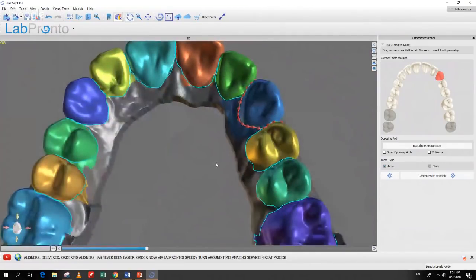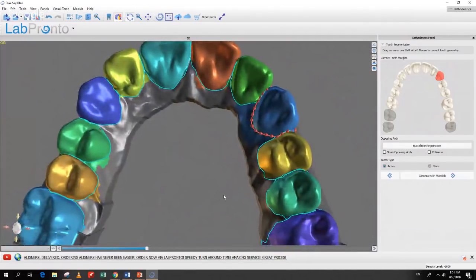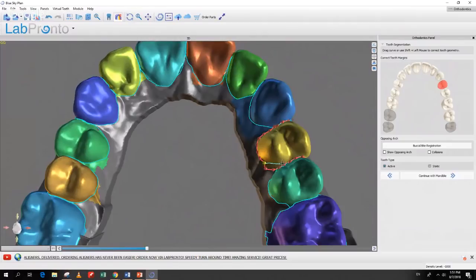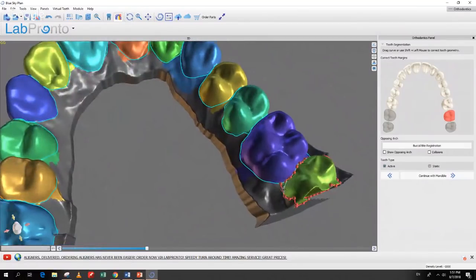Now you can notice that between teeth, the curves overlap, and you want to keep that overlap positioning. That's important. The curves are on top of each other. They're merged. If the curves of the different teeth really overlapped each other, then you'd be creating an automatic IPR. And if the teeth were separated, then you'd be creating an automatic space between the teeth. So you want to keep the positioning that the software is offering, or at least be careful with how you modify it so that the curves between the two different teeth are as unified as possible.